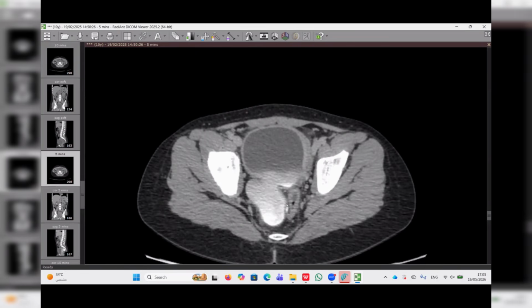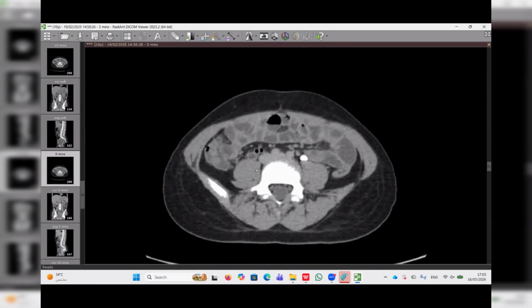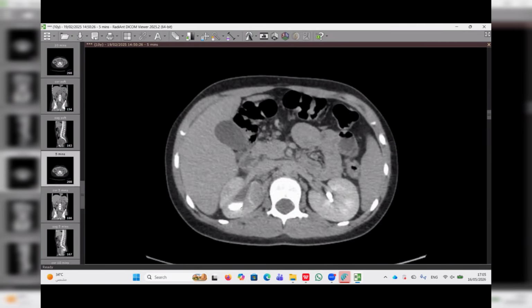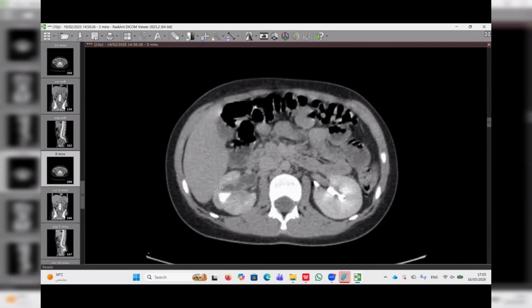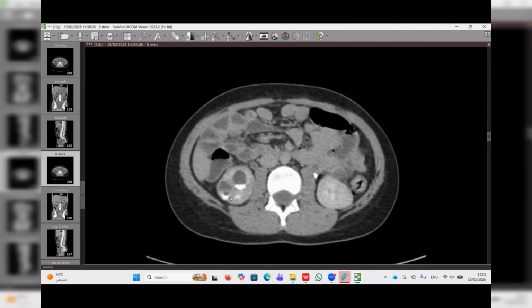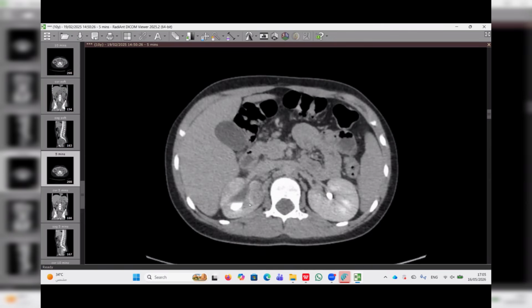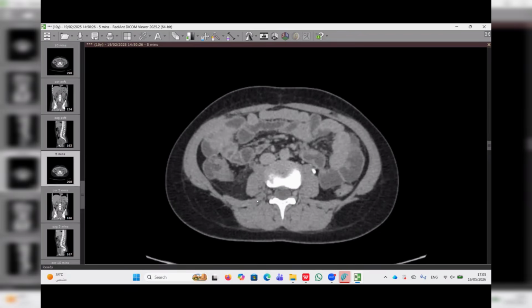So we have recurrent vesico-ureteric reflux causing pyelitis and recurrent ascending infection, acute pyelonephritis in the right kidney, and with renal abscess. And we have cortical scarring because of recurrent previous old infection. Okay, thank you so much. Perfect. Candidate, now you are candidate number 4. Is that correct? 5. 5.